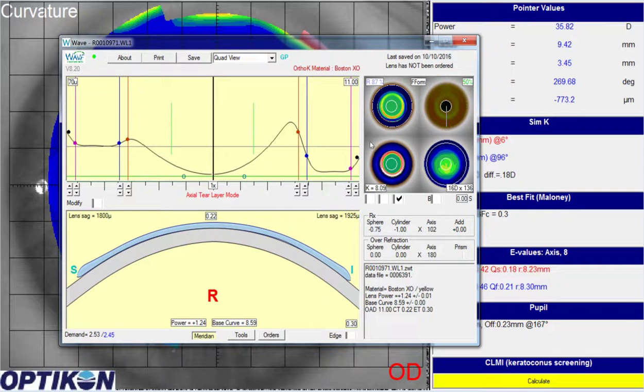We do have to go down to this side. And 746, 17 micron differential will be 729.